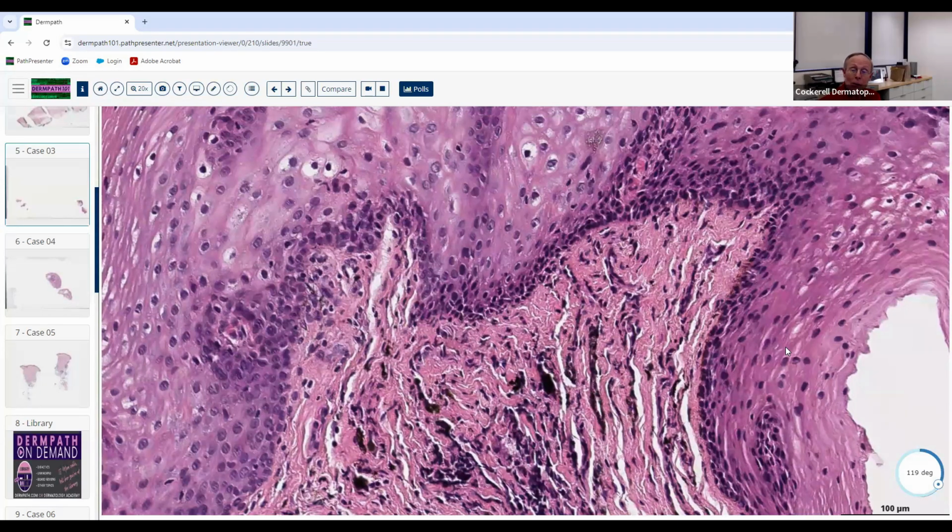You're going to be biopsying some possible nail unit melanomas over the course of your career. When you do those, you want to make sure that whoever's looking at it knows what they're doing, because those can be quite subtle. They look a lot worse clinically than they do histologically a lot of times. So we don't see nesting, and we'd want to look for dendrites, and we don't see those. But we do see some kind of color change here. There's some pigment at the base of the epithelium, and maybe even some in the epithelium up here too.